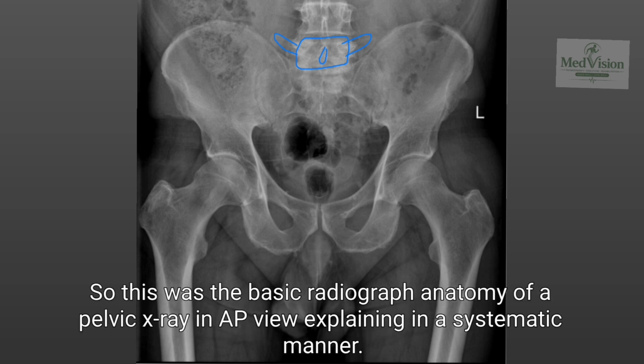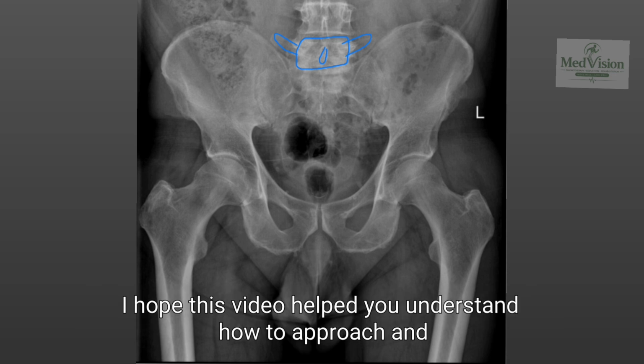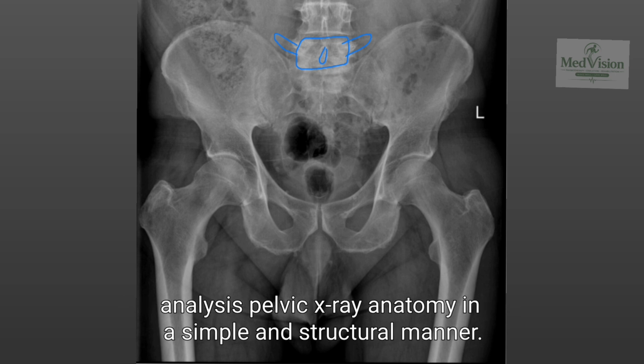So this was the basic radiographic anatomy of a pelvic X-ray in AP view, explained in a systematic manner. I hope this video helped you understand how to approach and analyze pelvic X-ray anatomy in a simple and structured manner.